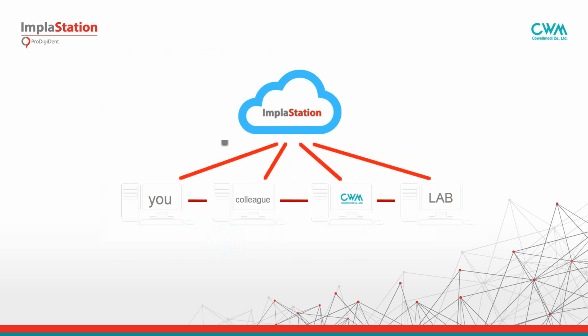Digital lets you do it remotely: take decisions about the treatment plan, communicate with the team, consult, discuss and teach. There is an embedded cloud service for file transfer in ImplaStation, but if you need, you may use a third-party big file transfer service like WeTransfer and others.